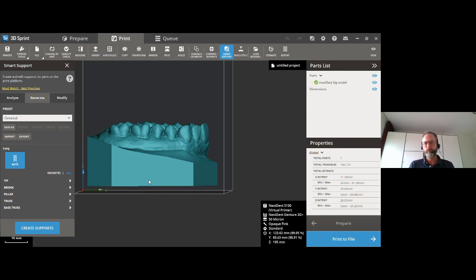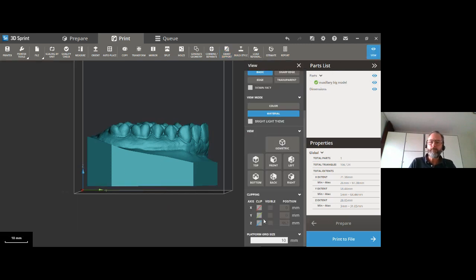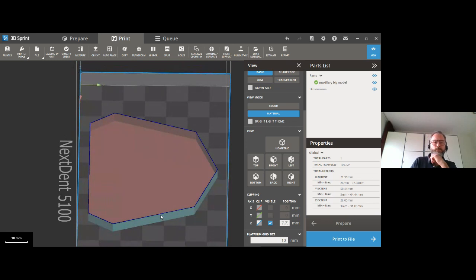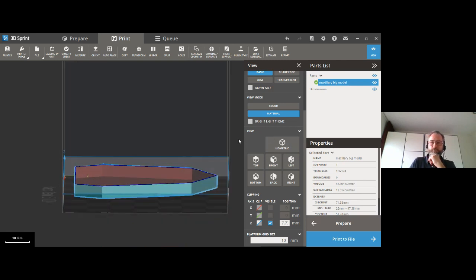Very good. Maybe it is also a good idea to check the printability manually yourself in the slice view or in the cut view. Menno, do you want to elaborate a little bit on that, in the view function, the Z cut? Yeah, you're referring to this. Well, with this, you can first of all take a look if your supports are on the lowest points, that you don't have any free starting zones, and maybe also a little bit notice about the cups.